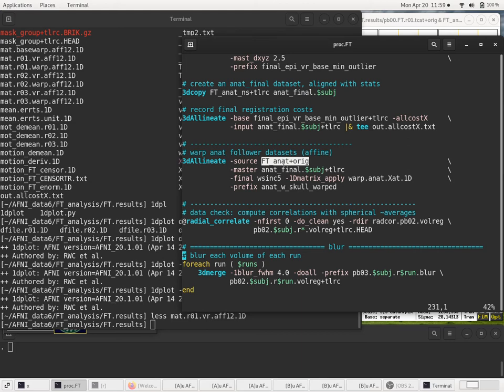This is another QC volume that I like to have. It puts the anat in standard space, but it still has a skull. Sometimes when we're pondering registration or strange blobs of apparent BOLD activity slightly outside the brain, we want to understand, are we in CSF or what? So it's nice to be able to look at a skulled version of the anatomy as well.